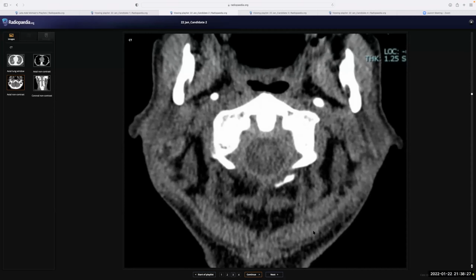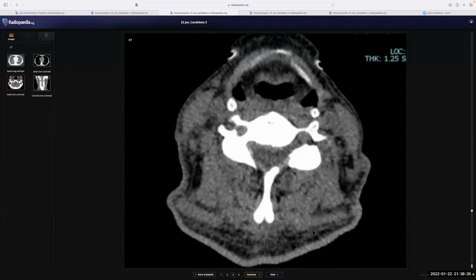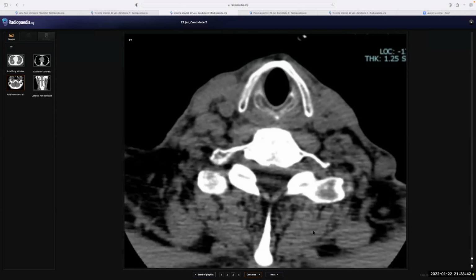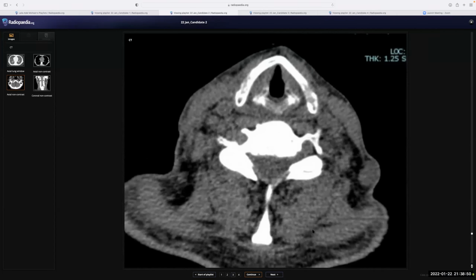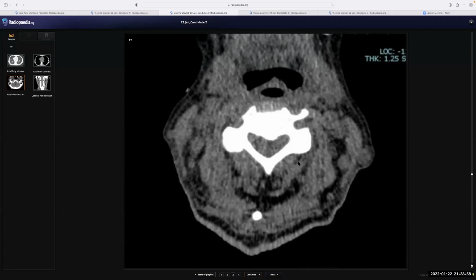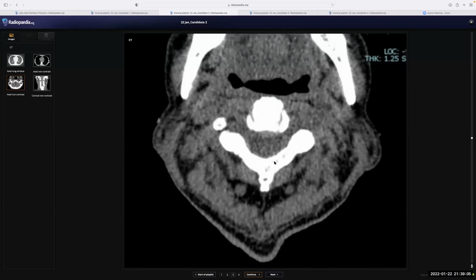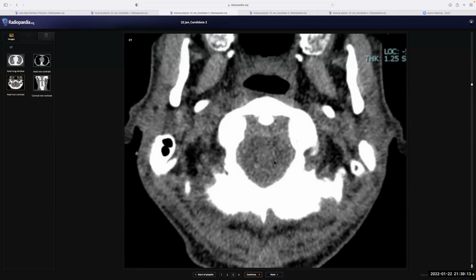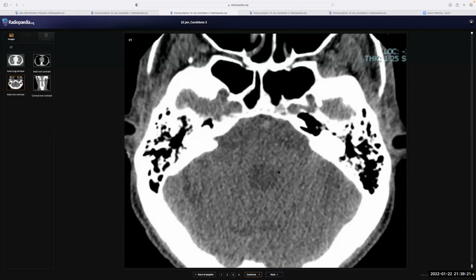I've also been provided with selected axial sections of the cervical spine and base of skull, it seems. I'll scroll through it, through the neck. These are again unenhanced. I'm scrolling down. This is without contrast. I'm going back cranially. I'm trying to look for lymphadenopathy. I'm trying to look for any obvious intraspinal lesion, although it is a bit difficult with the unenhanced CT. I still haven't been able to find an abnormality. Okay, can you focus on the nasopharynx?